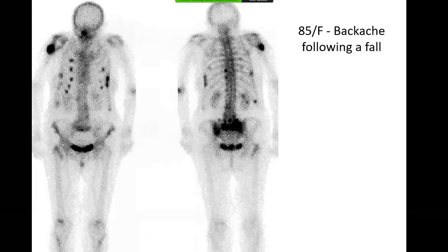So we just say these are recent fractures rather than use the terminology of a healing fracture. We cannot make that distinction between a healing or a healed fracture, because the degree of uptake just reduces a little bit. But important to remember is that the bone scan becomes positive after trauma within 24 to 48 hours. 48 hours generally applies to people who are more osteoporotic or old, but in a younger adult, the bone scan would be positive within 24 hours after the trauma.